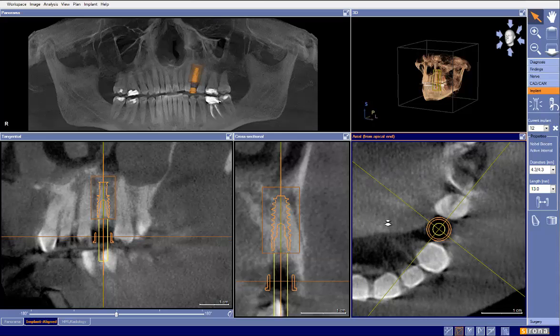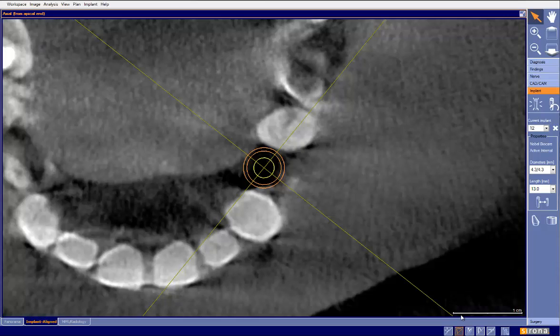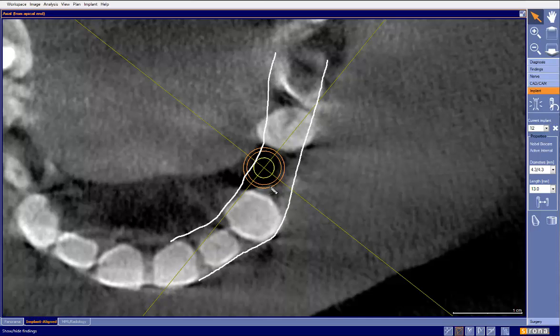Now what I want to go through here is our occlusal table, and I'm going to make our implant disappear here for a second. So actually I'm going to put it back on. What I would like to do is again pull up my trusty drawing tool here, and we can say that this is the lingual outline, that is the buccal outline. Here's probably the central groove area about right here. So what we can see here is dead center would put the implant in about this spot.